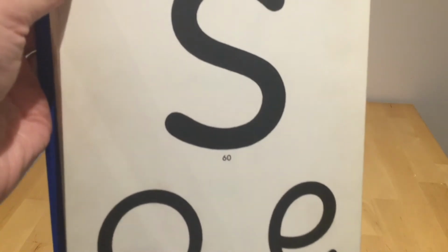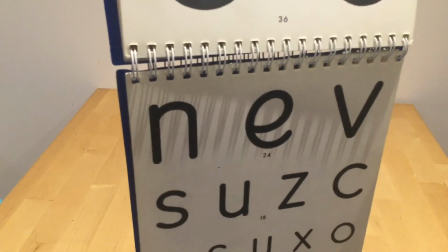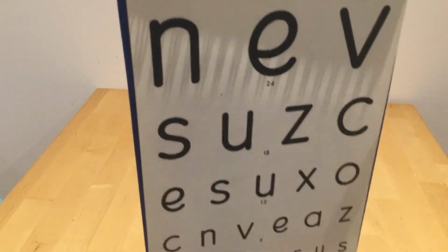So you would carry out this test, generally speaking, at 6 meters. However, if you couldn't find some place with that amount of room, you could carry it out at 3 meters. Depending on the distance that you are away would then affect how you record that acuity. But as I've said, I'll explain more about that on Tuesday. So you could actually hold this test at 1 meter if the child had significantly poor vision.